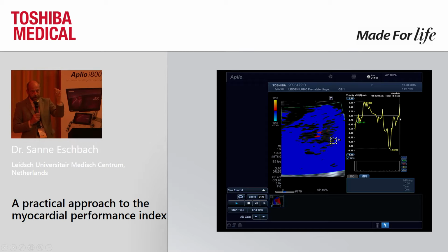And in fact, what you see over here is that it is not relying on the 20 or 22 milliseconds of the isovolumetric contraction time. It's more about the relation between the systolic and the diastolic period. Because in a fetal heart under stress, the diastolic period is shortening. And this is actually not in the MPI calculation, but that's something which we see, and that's what you see also here in this example.